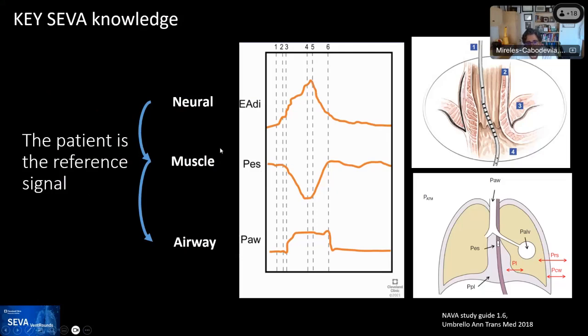If you then use the other technology that you can use available now on ventilators, it is to use the esophageal pressure. And the esophageal pressure, that's a catheter. I'm sorry, I didn't show this. So the NAVA catheter goes and captures the diaphragmatic signals through the esophagus through these sensors on a catheter.